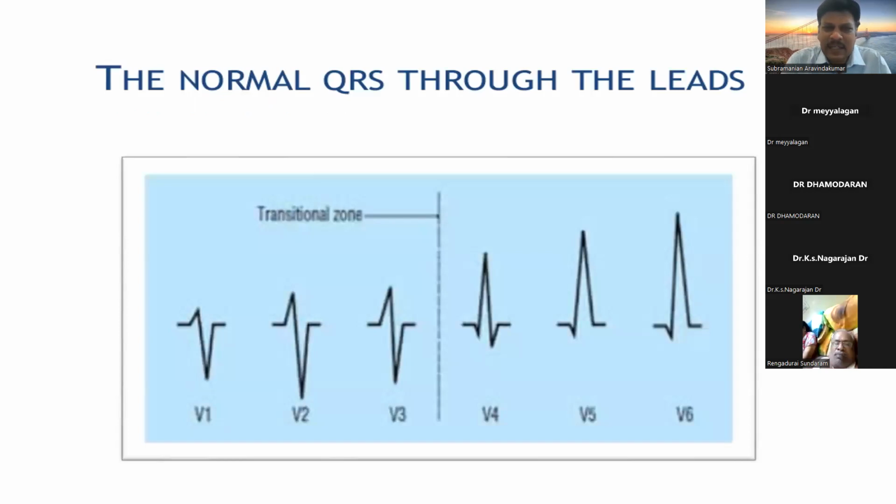To understand this LVH, we have to go back to the basics, the transition. From here, I'll try to annotate. This is the left ventricle.